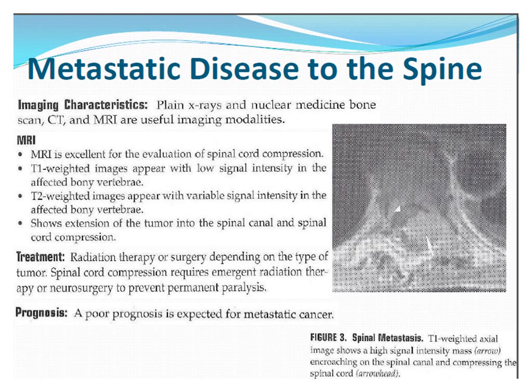So this is another picture in axial of the metastatic disease. In this case, the tumor here, because metastatic disease doesn't always just involve the vertebral body, can involve the posterior elements of the spine. This lesion has really spread into the canal and is causing severe narrowing of the cord. So this is an emergency when you see it this advanced.